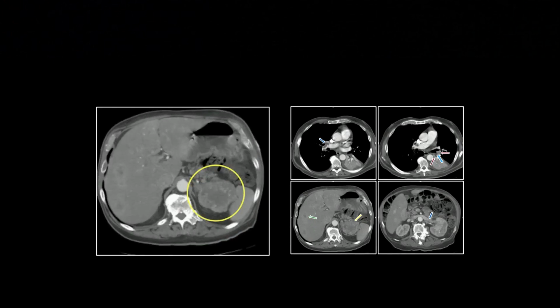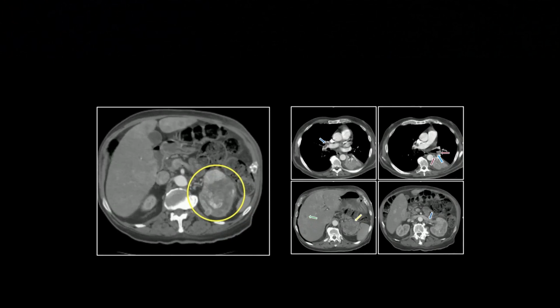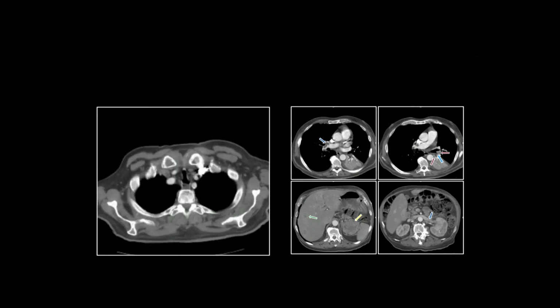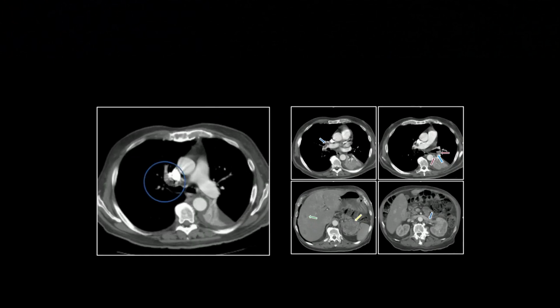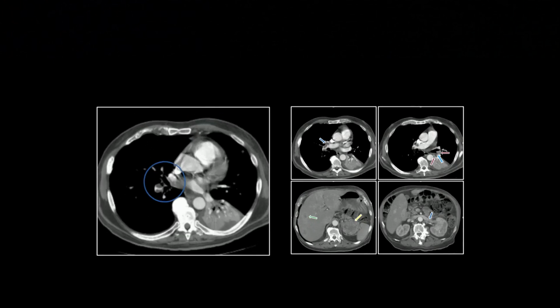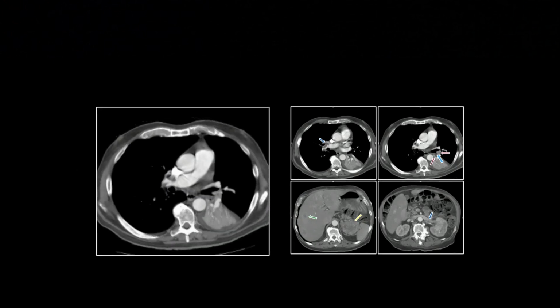So this patient has actually got normal ventilation perfusion in one lobe of his 5, right? The left upper lobe is the only thing that's getting both ventilation and perfusion. So a hyper-emergent version of pulmonary embolism here. Okay, so there again were the filling defects.